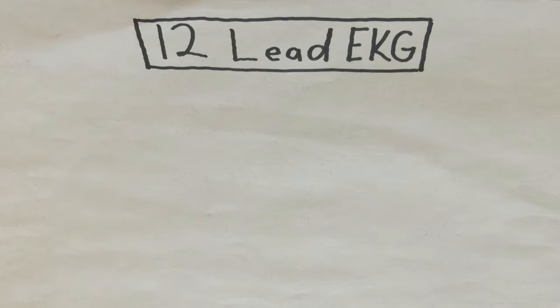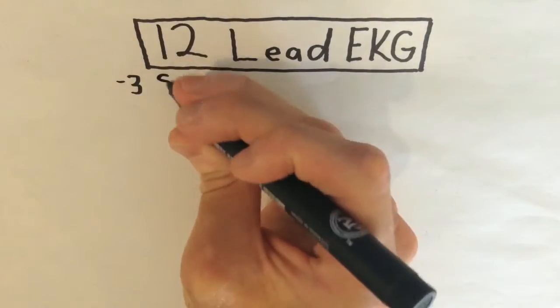Today we're going to discuss a 12-lead EKG and some clinical applications pertaining to EKGs. This video is assuming you already have the basic understanding of the waves represented on an EKG. Now we will look toward applying those concepts as well as viewing a test question related to the topic.